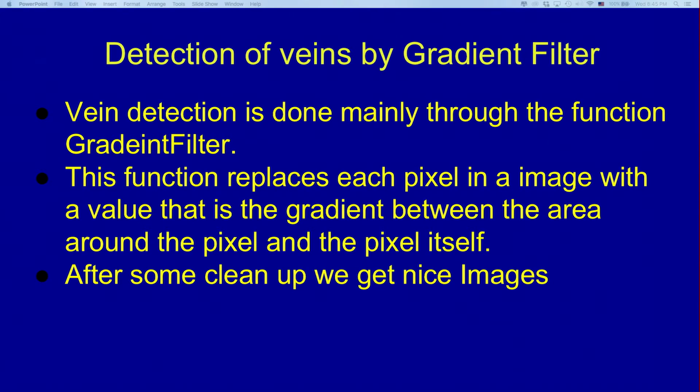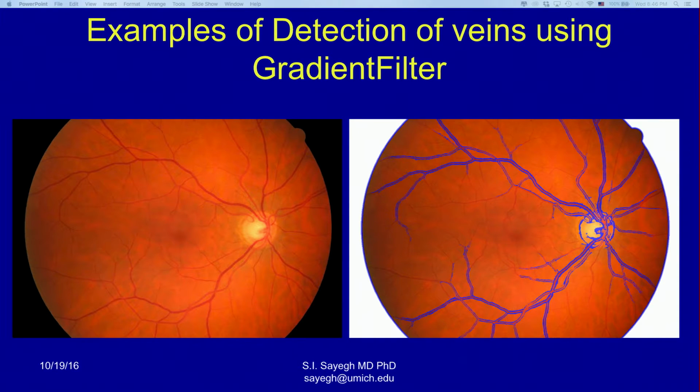And then the vein detection is another method we're showing, which we saw earlier. So we're highlighting the veins in the eye, which can be important to know, like what the structure of the vein is, for identifying certain diseases that might be affecting your eye.